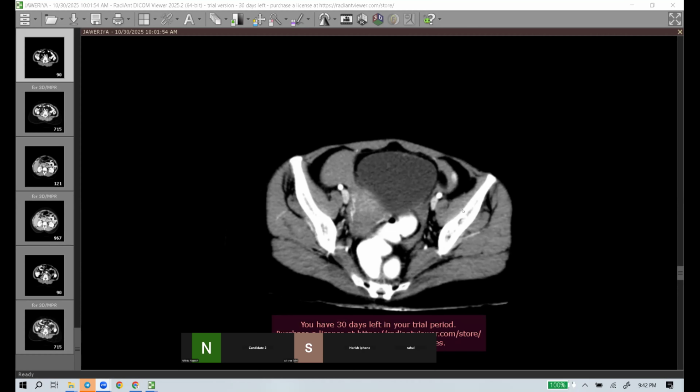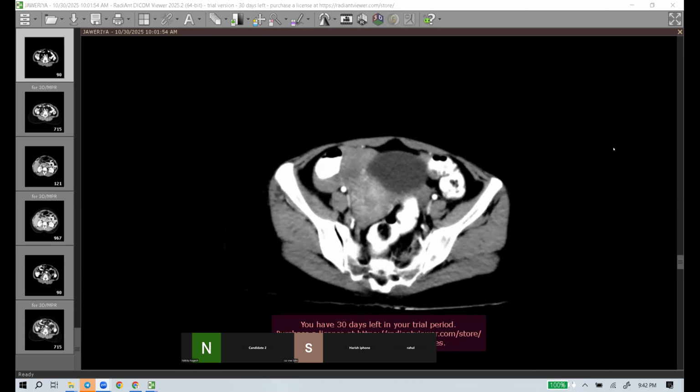Okay. Anything else with adnexa, non-ovarian, torsion, sir. Whether it could be an enlarged edematous right ovary. So, as I said before, I would like to confirm the findings on ultrasound if I can see the ovary and the vascularity. Anything else?